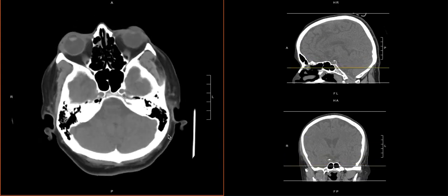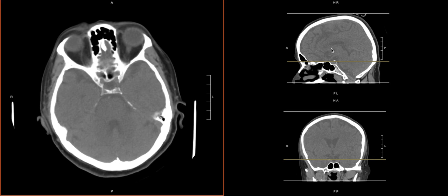At this point, we've looked at everything, but if we need to corroborate, we can look at our other orientations here.